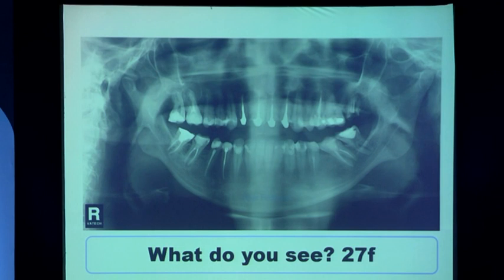But what exactly do you see? Anybody? Okay, when you look at the palate here, just try to follow the palate, right? When you see the palate here, there's something pokey here at the angle of the mandible. Do you think this is normal? Is this seen in every radiograph? No, this is not seen in every radiograph.